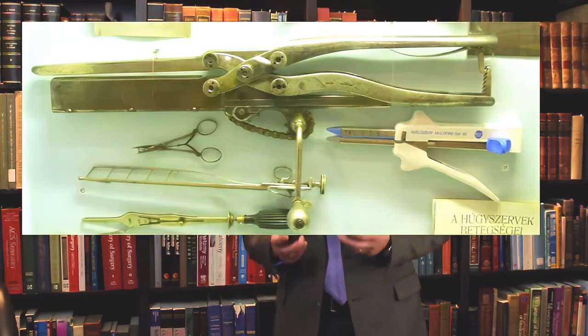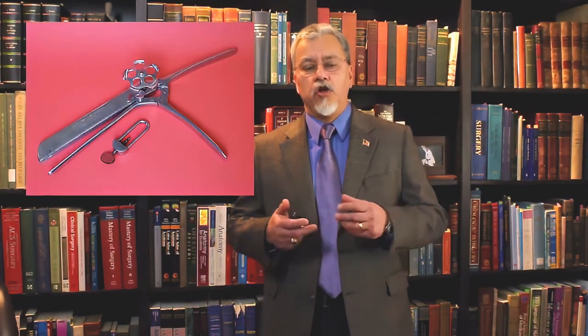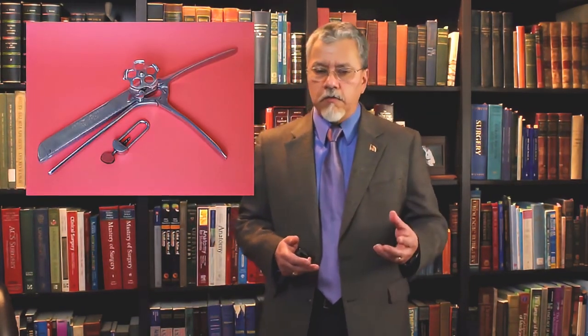An interesting historical side note is that Hültl's stapler was so heavy, so cumbersome, so difficult to use. The concept was good, but the instrument was difficult to use. He only sold 60. It was not until 1921 when Dr. Aladar von Petz, another Hungarian surgeon, invented a new stapler following Hültl's concept, but it was so much easier to use. It sold by the thousands. It used silver staples, and this was truly the beginning of the era of surgical stapling.